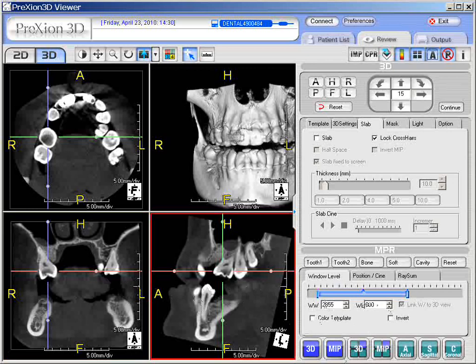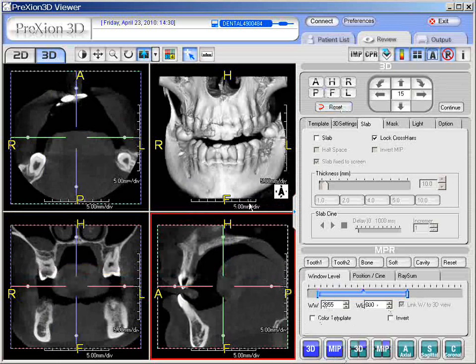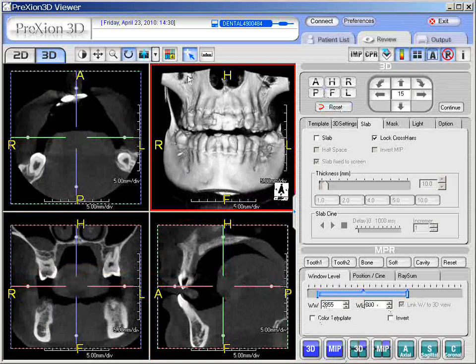Now, we must discuss when the pixel value density will not work and what it will not work with. First of all, it does not work with 3D. So if you apply 3D and pixel value, it will not work.